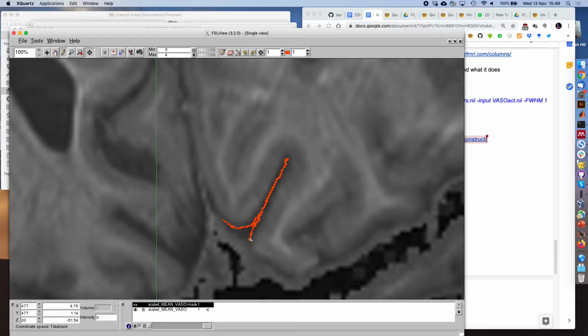Now, in real life practice, it's not that simple, right? We have, for example, something like CSF, then, again, this is our position, we have something like gray matter, CSF, and then gray matter again and white matter. So no matter where you put your voxel here, CSF is too thin. You will never have a voxel that's half filled with CSF. So actually, for this side of the cortex, you would want your borderline that's half filled somewhere here. For this side of the cortex, it doesn't make sense, right? You have always some curvature dependence on that.